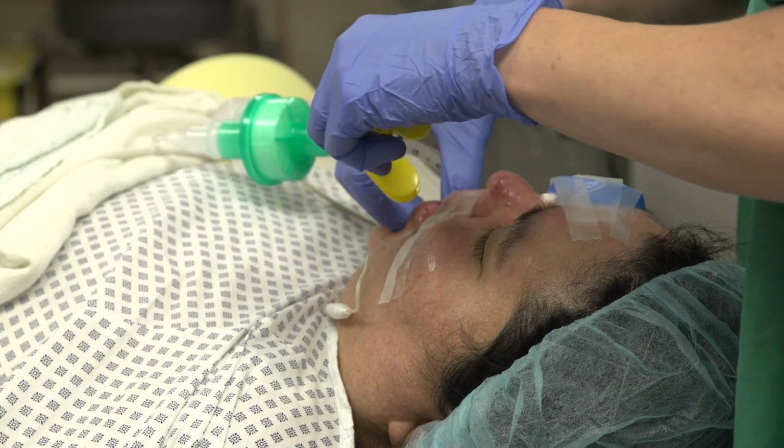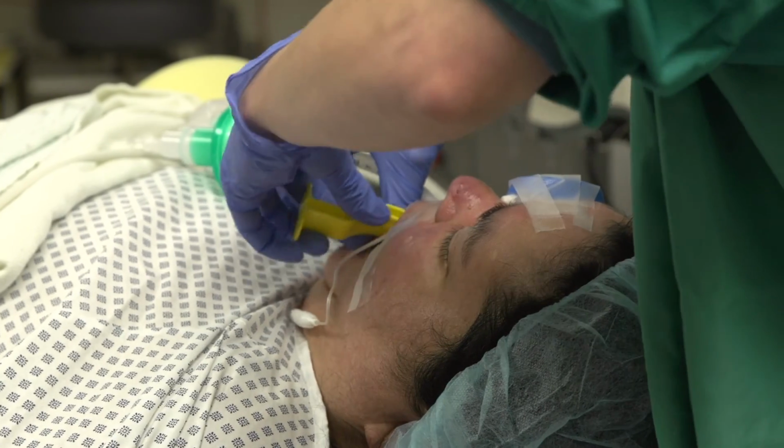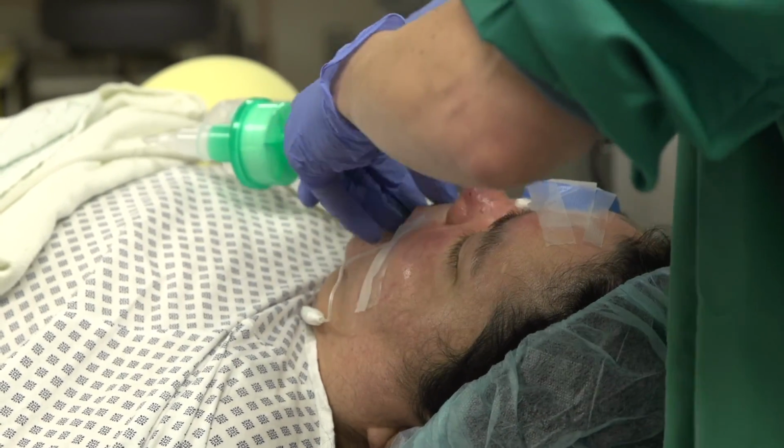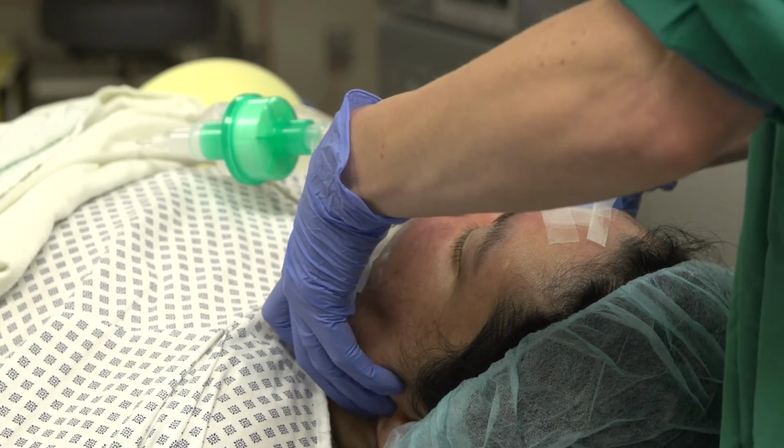The rebreathing loop can slowly be expanded to increase the amount of rebreathing and levels of rebreathed carbon dioxide when it has been determined that higher carbon dioxide levels can be tolerated. Use a bite block. In vigorous spontaneous ventilation, biting on the endotracheal tube or LMA could greatly increase the chance of a patient experiencing negative pressure pulmonary edema.